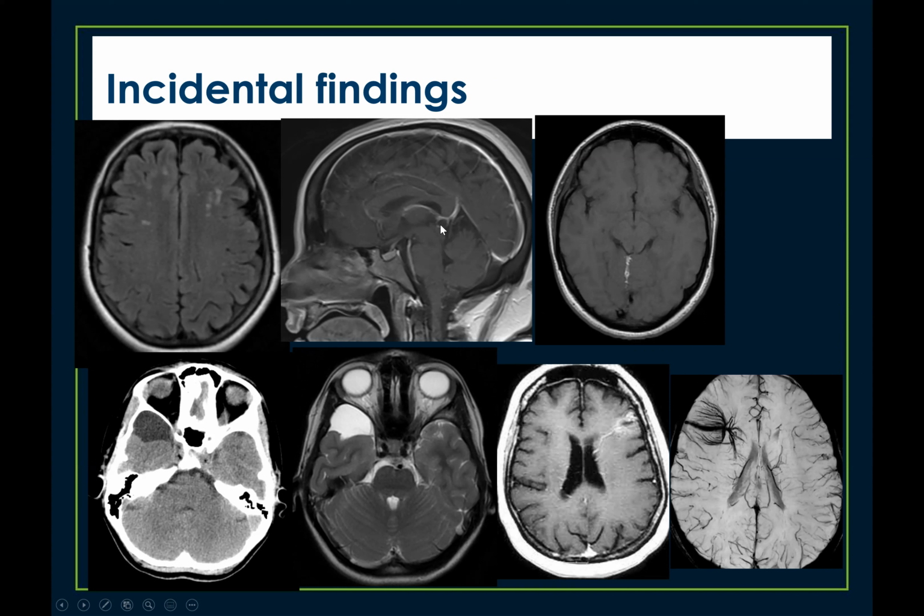And if the walls are very regular and you have no nodularity, it is a simple pineal cyst. But I still prefer to have at least one contrast enhanced study. Of course, we see sometimes intracystic hemorrhage, and they might also increase in size, but usually with clinical manifestations.